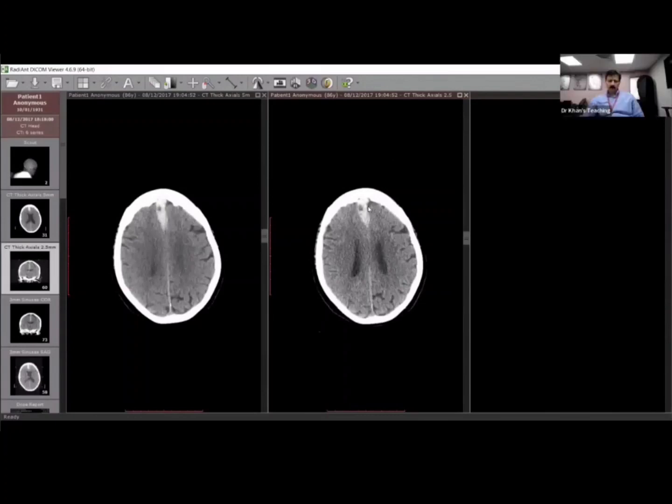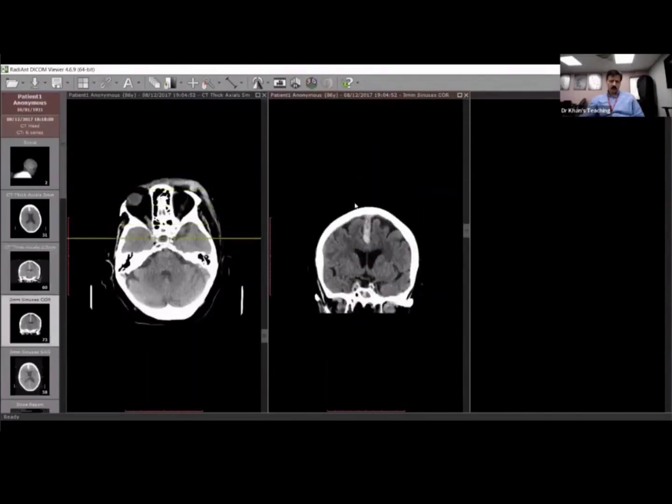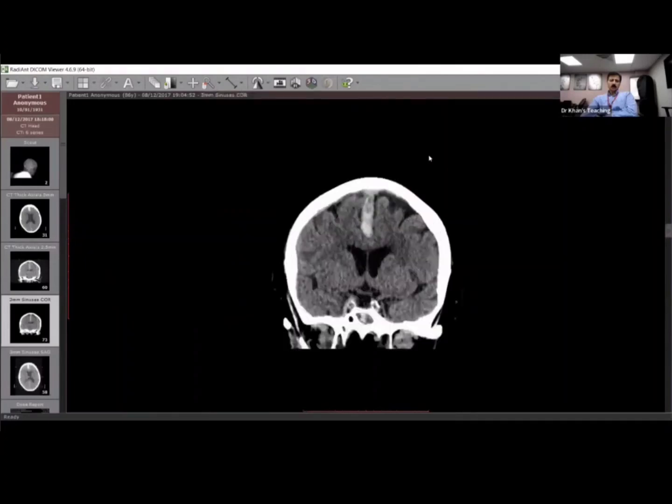Yeah. Okay, sorry. So this is the coronal. Over to you. Okay. If you double click it, it will become larger. You want it larger? Yes, sorry. Leave the mouse for me. Yeah, sure. Okay, over to you.